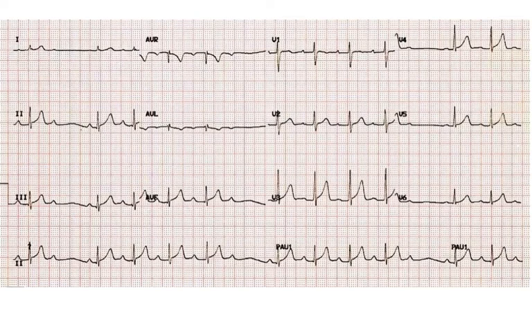Okay, so in this ECG, the rate looks normal. The rhythm is clearly irregular. P waves are visible. And if you see that there is a PQRS complex, and then suddenly there is one P wave which did not conduct a QRS complex next to it, that means there is a drop beat. Also, if you look at the PR interval, it is prolonged in this ECG as well. It's almost 6 boxes here, then 7 boxes here.